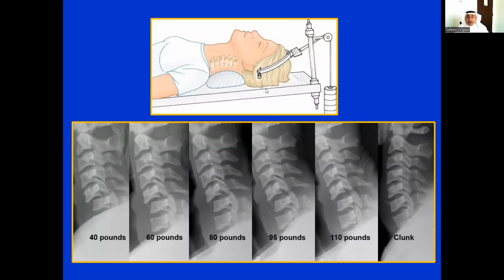Treatment is by putting traction through a halo that is screwed to the skull with gradual buildup of weight in order to pull the vertebra that has fallen anteriorly, to pull it back upward and reverse it back into position. You want to unlock this facet. So you have to pull it up and then place it back. And you can see from falling down with gradual increase of weight.